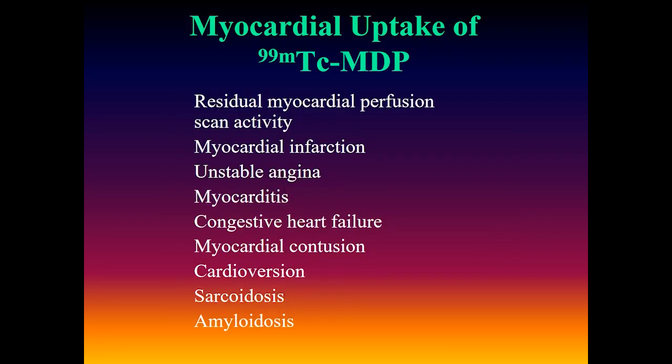There are numerous causes of myocardial uptake of technetium-99m MDP or HDP. Probably the most common cause is residual activity from a recent myocardial perfusion scan. Recent myocardial infarction can also present as areas of increased uptake on the bone scan. Others include unstable angina, myocarditis, congestive heart failure, myocardial contusions, recent cardioversion, sarcoid, and amyloid.